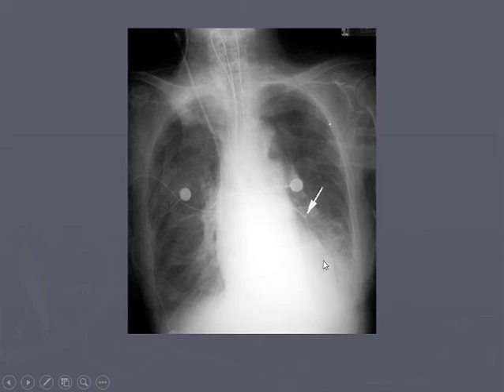So the story behind this one, a nurse put down a Dobhoff, and Lord knows how this happened, or why they put this much of a Dobhoff down the patient, but it looks like it became entrapped. Instead of going down the esophagus, they went down the trachea and up the trachea back to the top of the mouth, and went back down, and then ended up in their left lung. And considering this haziness, hopefully they didn't give any tube feedings through it. It's a possibility. I don't know the whole story behind it, but that's what that is, a Dobhoff.